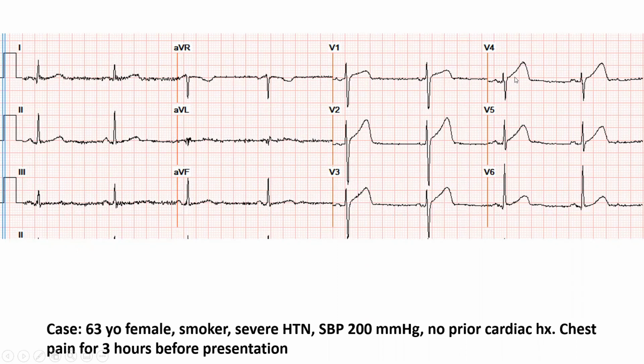Another idea is that the ST-T size in 2 leads approximates the QRS size. Whenever I see that ST-T dome almost equal to the QRS size or exceeding half of it, I worry: is this a shrinking QRS and rising ST-T as in a STEMI? That's what you have in STEMI, shrinking QRS before it becomes a Q and rising ST-T. So that was very worrisome to me. The other thing that was worrisome is no other explanation. If this patient had a big QRS of LVH, I wouldn't be worried about that ST elevation.